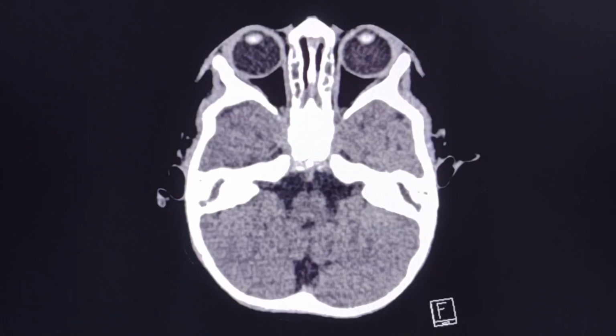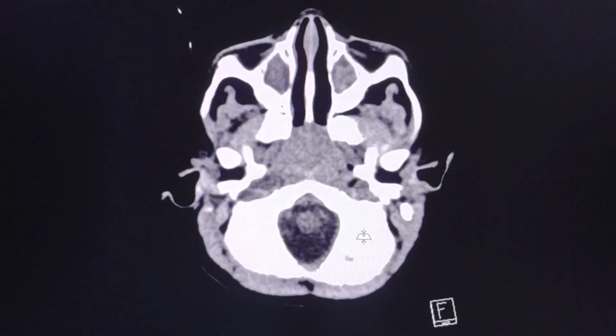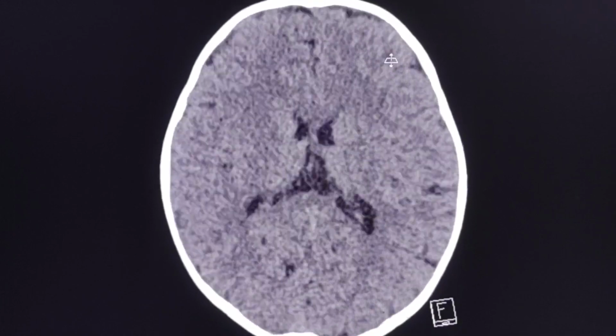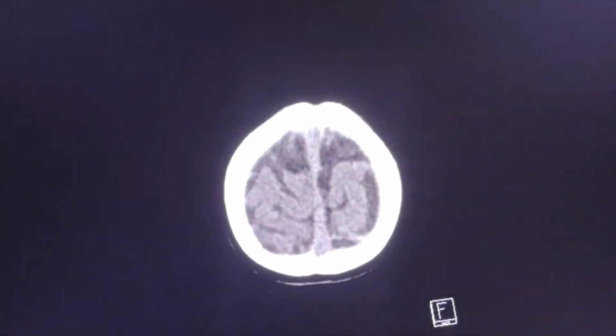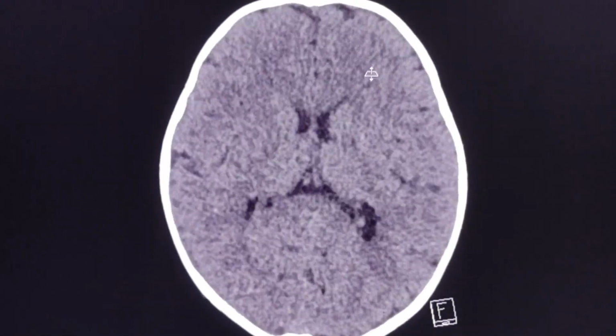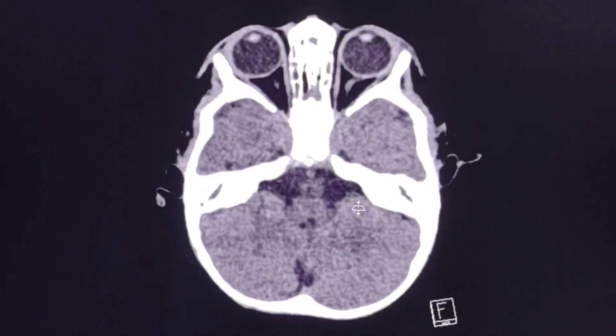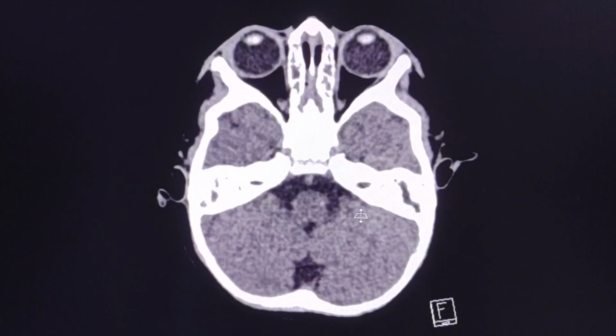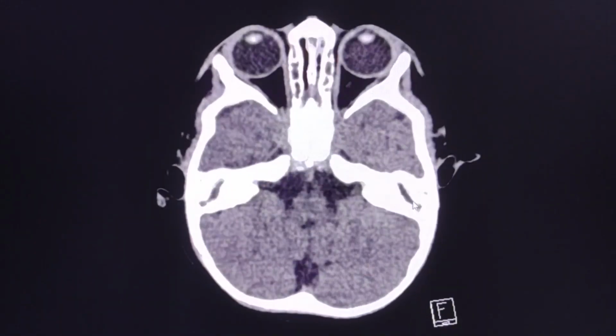presenting with increased frequency of seizures, and CT scan was done for further evaluation. The CT scan finally was normal, no intracranial pathology was found, but however, as an incidental finding, opacification of the middle ears and the mastoid air cells was noted.